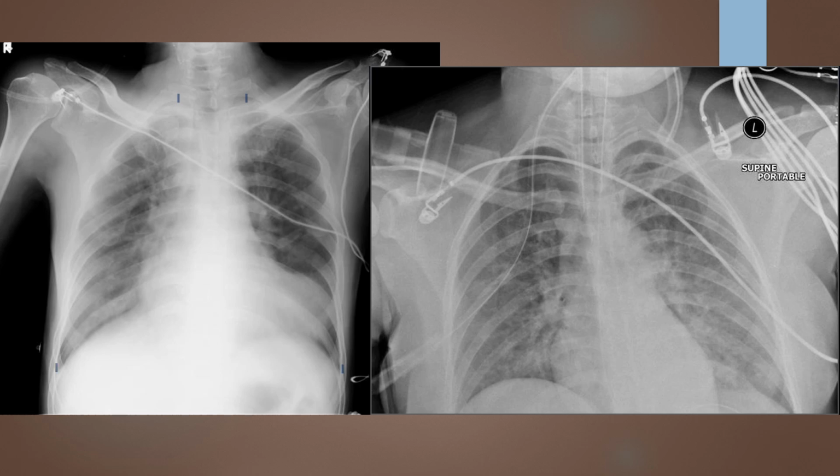Secondly, we're going to look at my legalities. So if this were to not be an anonymized image, I can see is my patient name there, date of birth, time, and facility and ordering physician there. I do see that there is an error. There's a letter marker on here. It looks like they put the wrong lead marker on and they tried to cover it up with a digital marker. So that's one of those that we already discussed, lead marker considerations. So our next thing is, let's go ahead and say we're going to go ahead and approve this to go on to the next step.